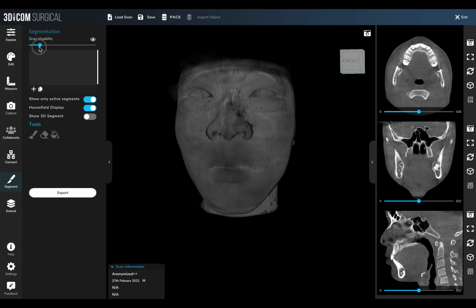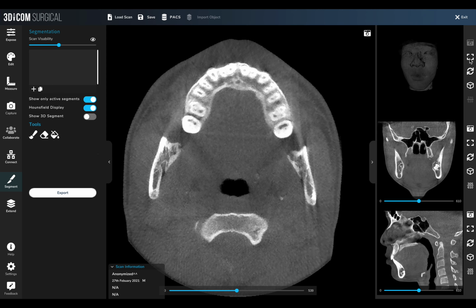So you can see that it changes the opacity, but it doesn't really seem to do anything else. I'd also think that clicking that there would actually toggle the base volume on and off, but it doesn't seem to make any change. Clicking on here, it's pretty obvious that you can double click. However, I think you need to have a pencil icon next to the name so that you click there to actually edit it.